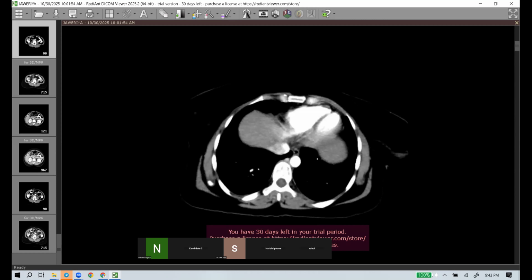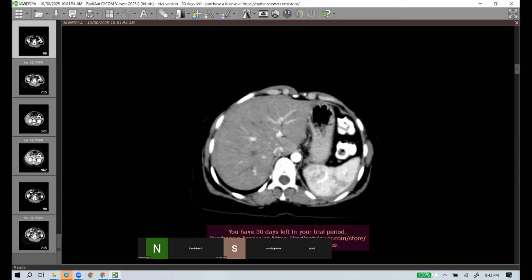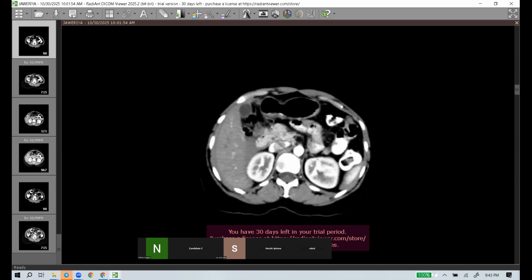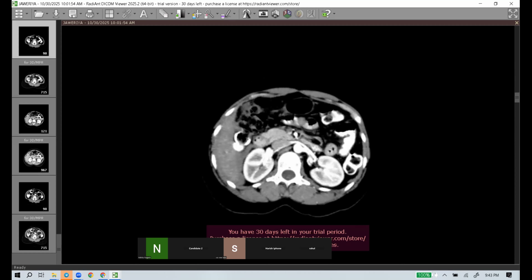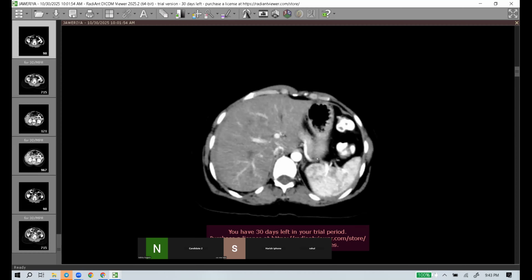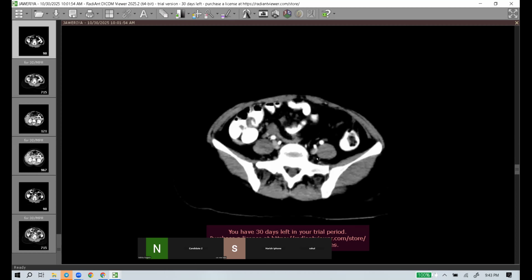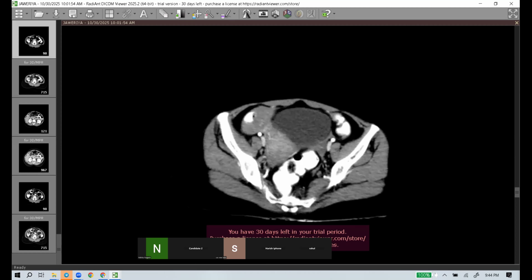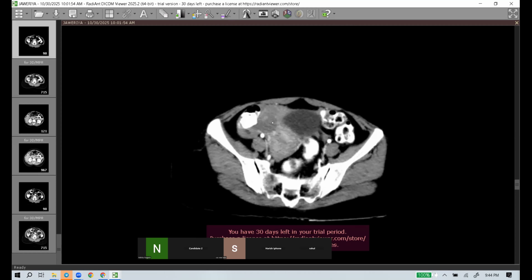So this one you picked all the findings. You started well. You said it's a contrast enhanced phase. You said you'll see the whole series before you comment. That's a very good habit, so that you don't jump into a conclusion about something in the upper abdomen which is out of interest. Then you went directly to the point that there is abnormality in the right adnexa, and you started describing the enhancement, the adnexa, the left adnexa is normal, and the relation surrounding it.